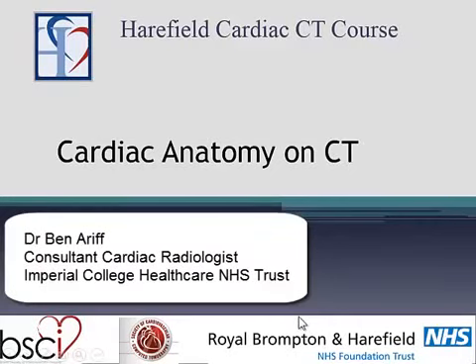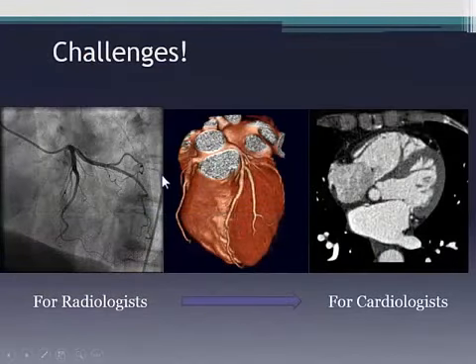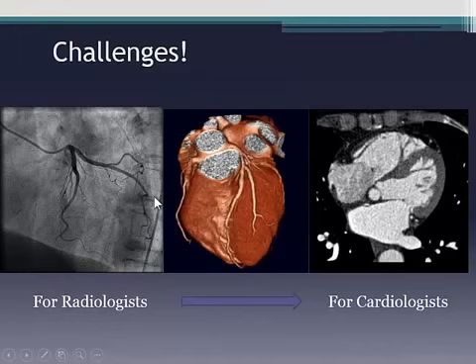Okay, so what we're going to do is just go through what you've gone through already. Obviously, from the radiology challenge, it's really about orientating yourselves with regards to the coronary anatomy, but also the cardiac chambers, because traditionally we kind of close our eyes to looking at the heart. And from the cardiology point of view, what you're going to have to get used to is looking at images in a totally different way, in the orthogonal planes, in the multiplanar format.